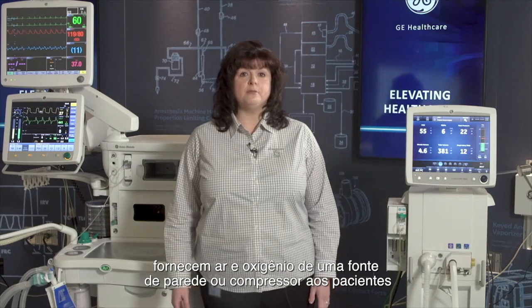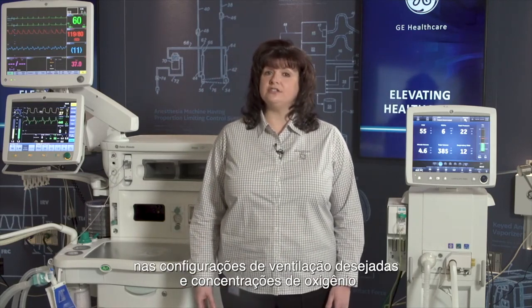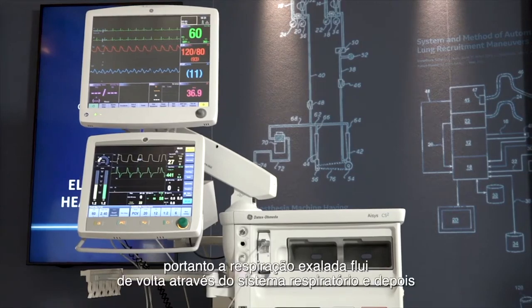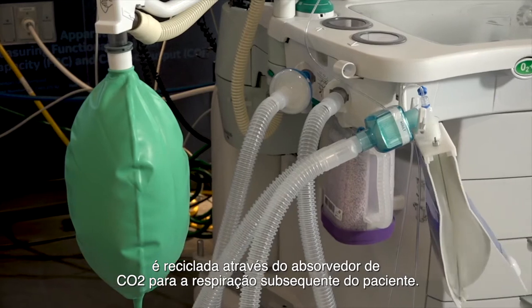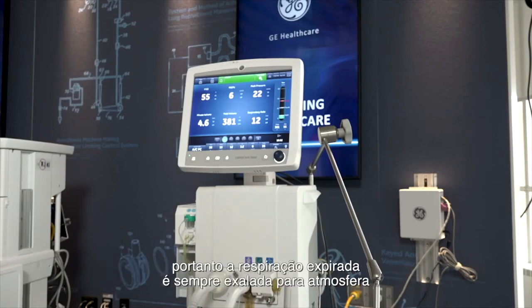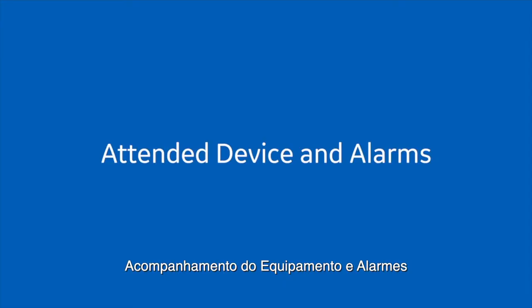The GE anesthesia machine and ICU ventilator both provide air and oxygen from a wall or compressor source to patients at the desired ventilation settings and oxygen concentration. The GE anesthesia machine is a rebreathing system, so exhaled breaths flow back through the breathing system and are recycled through the CO2 absorber for subsequent patient breaths. The ICU ventilator is a non-rebreathing system, so exhaled breaths are always vented to the atmosphere.